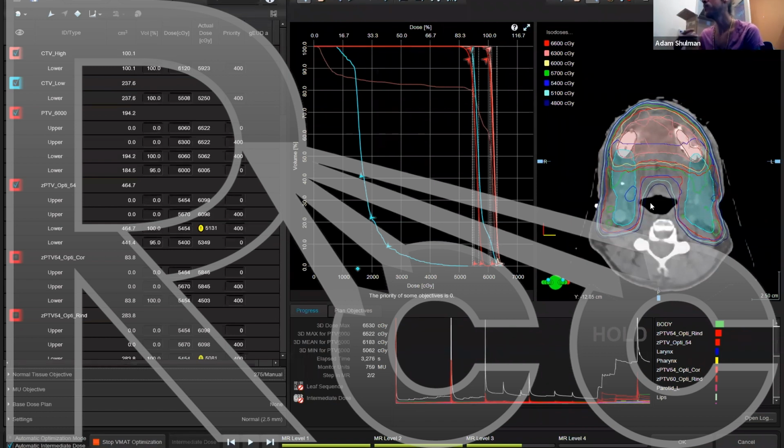That being said, we teach these principles. If you want to use the concepts that you've learned and extrapolate and make additions and improvements, I think that's great. So I think there are always ways of making improvements. We could use the same concepts of dose fall off, and we could generate a lot more organ at risk contours, and we could do organs at risk inside the PTV or outside the PTV.